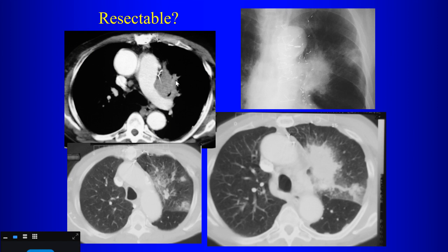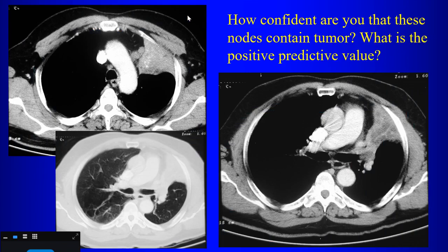What is the tumor doing? Abutting and maybe encasing a pulmonary artery. Is it abutting or doing more than just abutting? It looks like it's encasing. Well, it's right up against it, and there's some irregularity along the wall of the pulmonary artery, right? So here we'd be concerned about invasion of the main pulmonary artery. So is this resectable? No. So that tumor is also unresectable, okay?